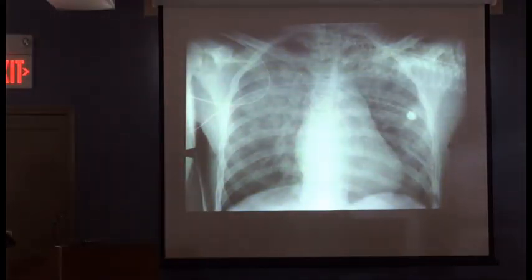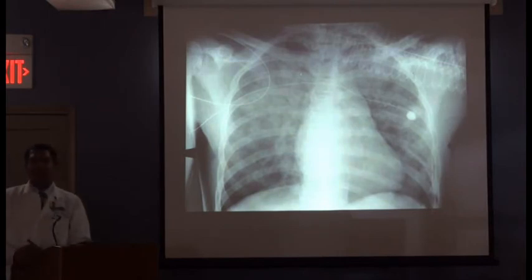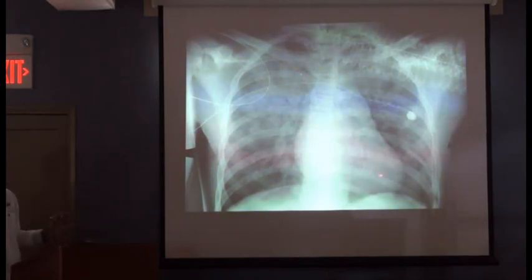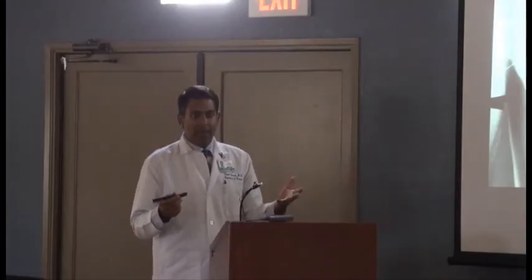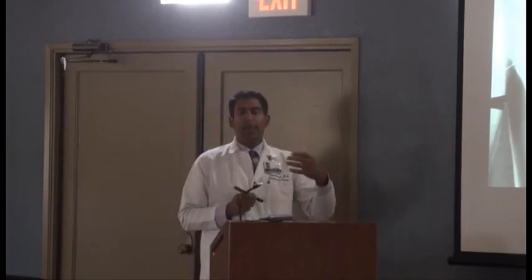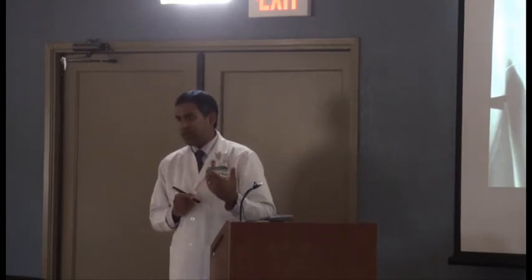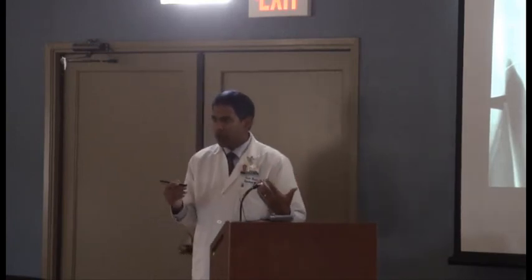Okay? This is kind of an interesting one. What's going on over here? All right, this is a non-trauma x-ray. Someone said the heart. What about the heart? It looks pretty darn big. All right, so let's take this. This is a patient who is in our ICU who has a little bit of hypoxia going on. We get a chest x-ray. You see a clearly enlarged heart.